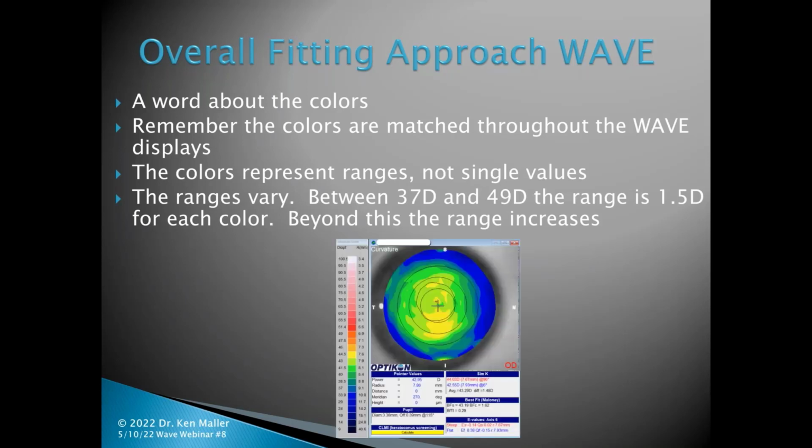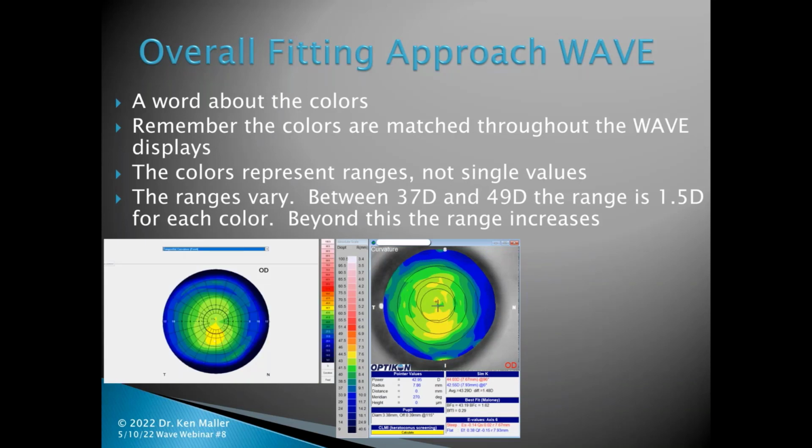So this here happens to have been on the Scout topographer. This here is on the Pentacam. And I think you would see that they have very, very good agreement in terms of their overall color distribution. Let's see how Wave did with that.